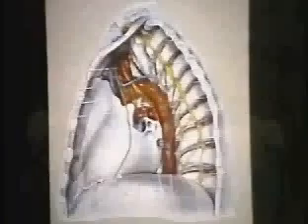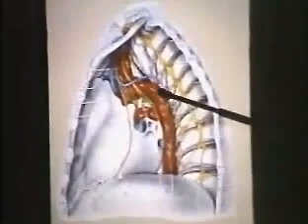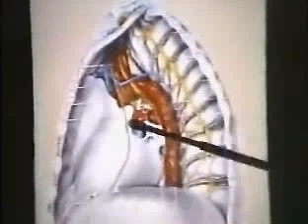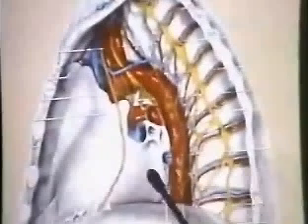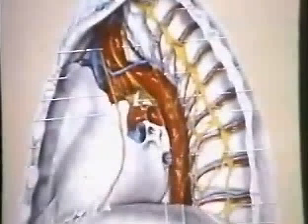This is the radiograph of the patient whose arteriogram you've just seen. If we look on this side on a diagram, we see the aortic arch that we've just been going through, and we see the gap below the aortic arch and above the left pulmonary artery. Now, if you look in that region very closely, you'll see a white band here. That band, of course, is ligamentum arteriosum.